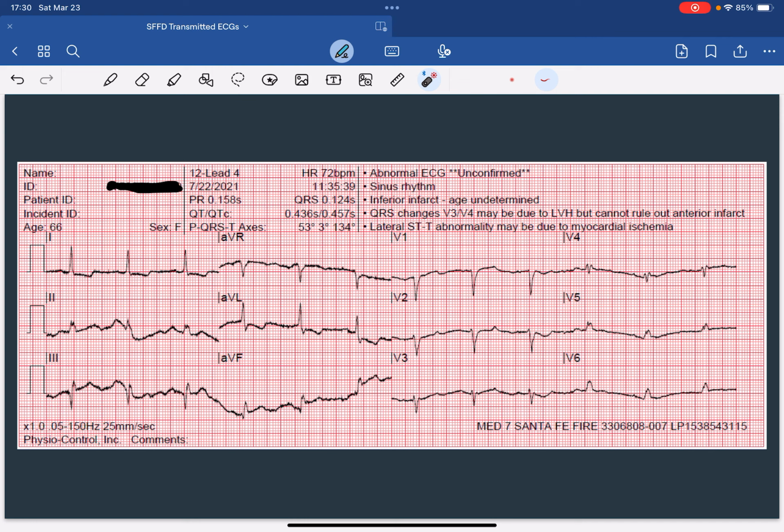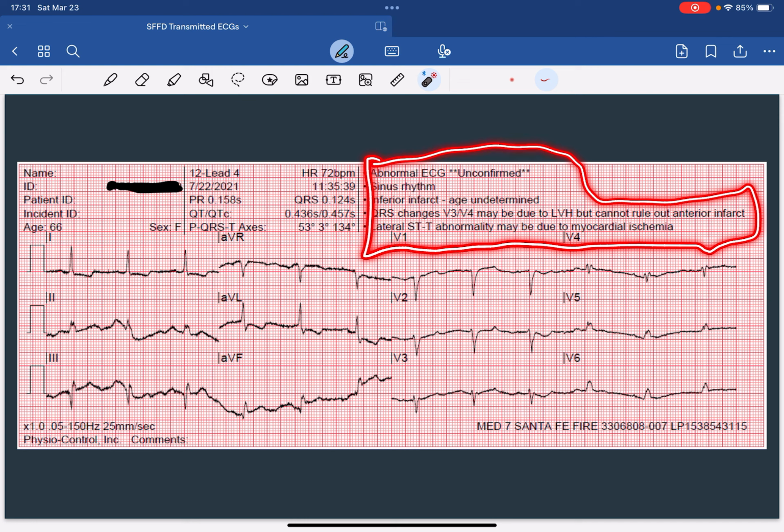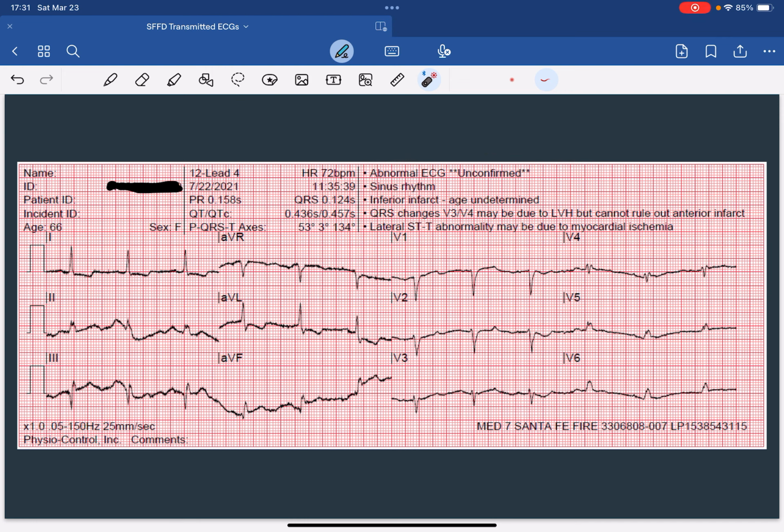So as you can see, in this particular case, I've opted to leave the computer interpretation open because this is going to be a classic case of man versus machine, in that we're going to prove the machine wrong and point out the absence of diagnostic accuracy with this particular interpretation. So having said that, let's move on.